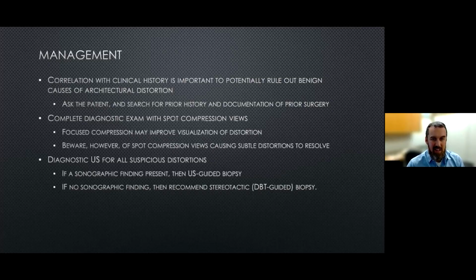based on just the screening exam, it's important to go ahead and do the diagnostic ultrasound where you think the lesion might be, because I have had at least a couple cases where we see it really well on the screening exam, but the patient presents for diagnostic imaging, and it doesn't look very exciting at all. We end up going to ultrasound and find a malignancy right where we expect it to be based on the screening exam. So diagnostic ultrasound is recommended for all suspicious distortions.